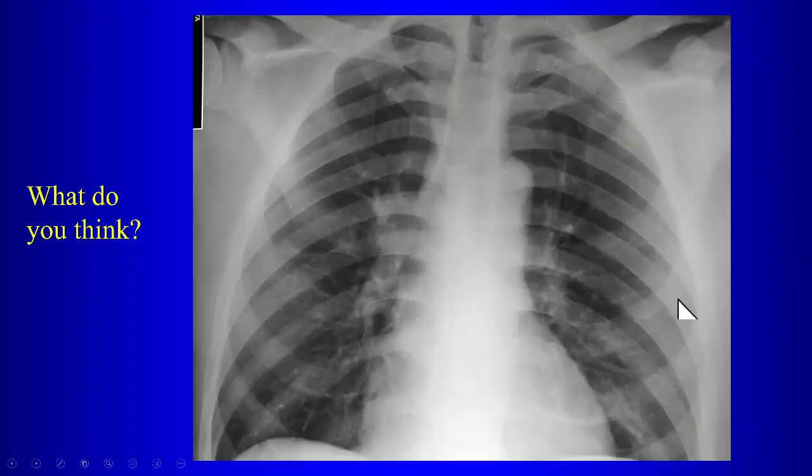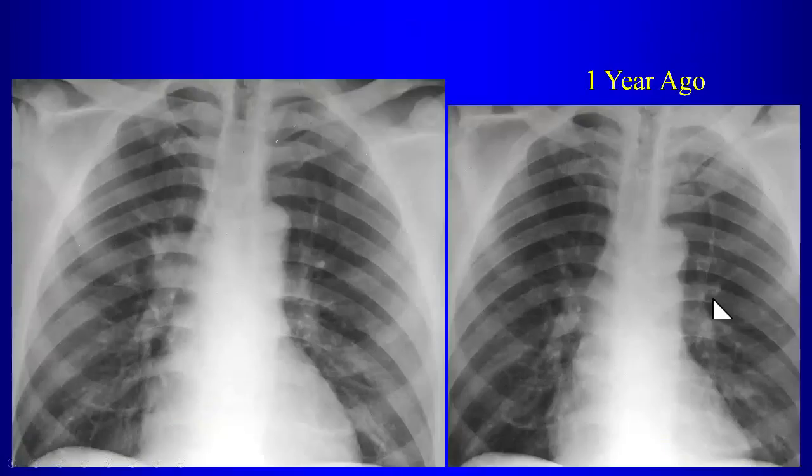Okay? So, when we look at this radiograph, is there anything that bothers you? Convexity at the right hilar angle. So when we look here at the right hilar angle, maybe there's something bulging out here. Now, the radiologist's best friend is prior films. So it is important to compare with prior studies. By the way, the only thing better than old films is future films.